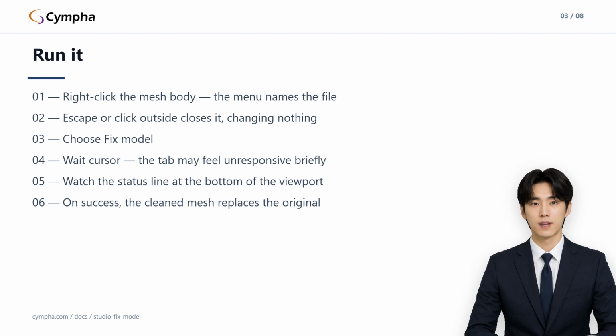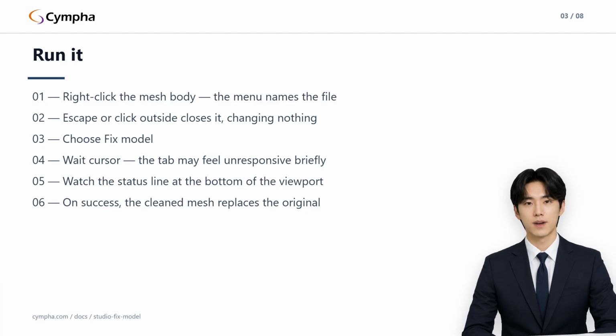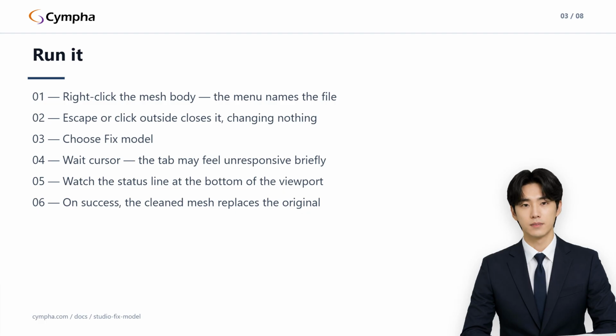It says running pipeline at the start, and on success it reads Fix Model complete, holes up to 5 mm, non-manifold, clean, smooth. On failure it says Fix Model failed, with a short reason. On success, the clean geometry replaces the original in the scene, in place.